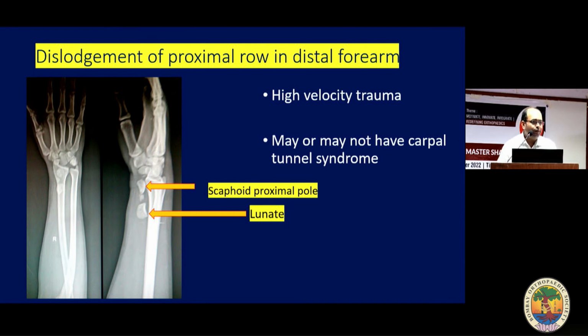This is extremely high velocity trauma. Usually they have associated injuries, and on X-ray we sometimes see loose pieces of bone. If they are conscious and well oriented, they may have symptoms of carpal tunnel syndrome. So don't miss out on these X-rays also.